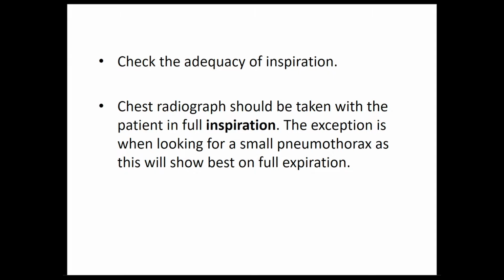Secondly, check the adequacy of inspiration. Chest radiograph should be taken with the patient in full inspiration. The exception is when looking for a small pneumothorax, as this will show best on full expiration.